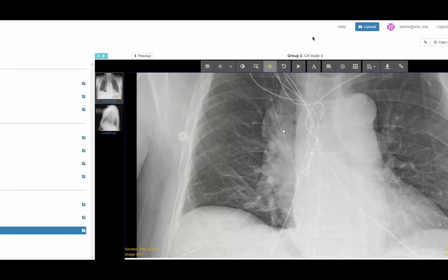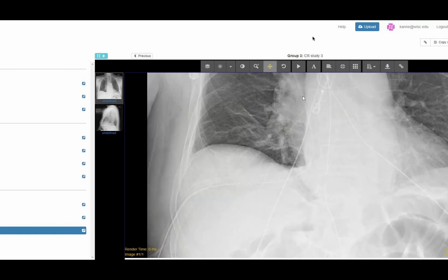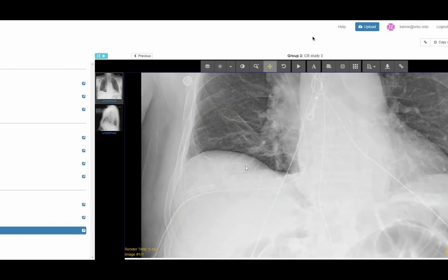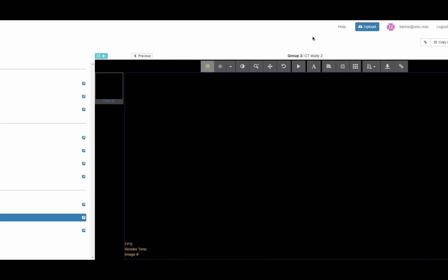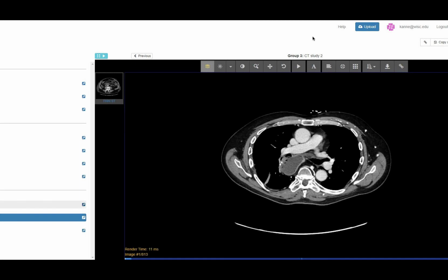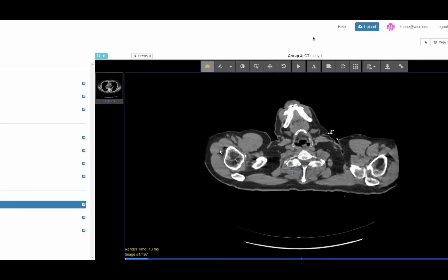One of my colleagues had noticed on this radiograph that there were some branching lucencies in the upper abdomen. The bowel is dilated here, which I think drew some attention. It looked kind of funny. So they were concerned about some ischemia in the bowel with some portal venous gas. So the patient went to CT. That's the abdominal CT. I'll show you the chest CT first.